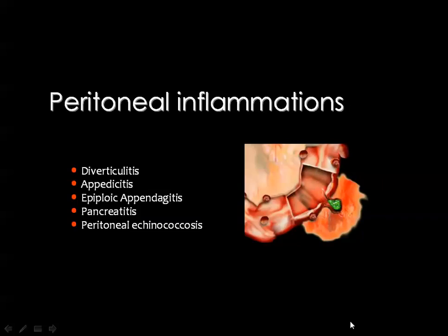Then we came to some causes of peritoneal inflammations, and we'll discuss these issues: diverticulitis, appendicitis, epiploic appendicitis, pancreatitis, and peritoneal echinococcosis.